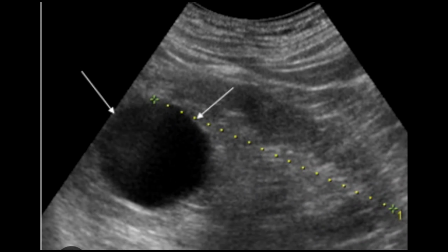It's a close-up of the renal cyst. Here these white arrows indicate the simple cyst. This is a simple renal cyst, and this is a serous cyst. You can appreciate that the size is taken as for the kidney, so the same size should be taken in 2 dimensions for the renal cyst. Focus on the wall and focus inside on the contents, and if there is nothing, then this is the best criteria fitting the cyst as a serous renal cyst.